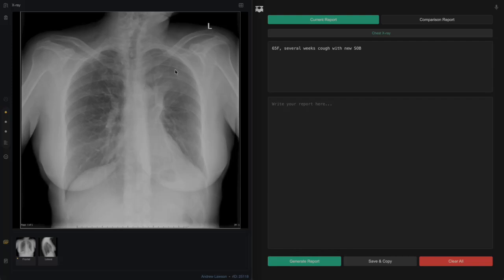You can really appreciate it here in between the rib spaces. And when we compare it to the same rib space on the patient's right-hand side, we can see that there is loss of all these nice normal lung markings that we usually would see. So as mentioned, this is very diffuse opacification. We can see it's probably at its most intense towards the hilum and within the left upper zone, and then it fades away as we get to the left middle zone and the left lower zone.